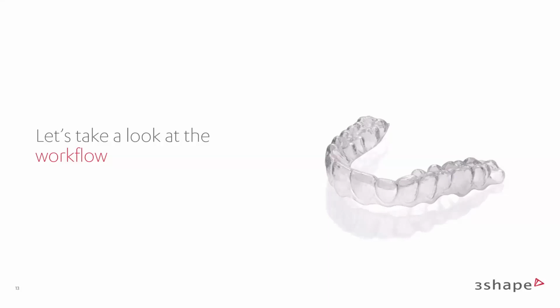How that has happened previously would be either them calling the lab or sending an email with instructions on, oh, please don't move the teeth in the lower mouth, and I don't want any attachment on this and that tooth. We have made a portal that enables efficient communication between the clinic and lab, and that is what I'm going to show you guys now.